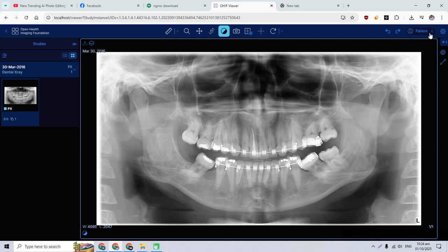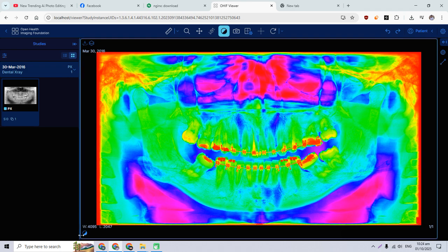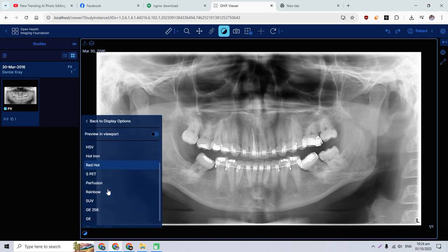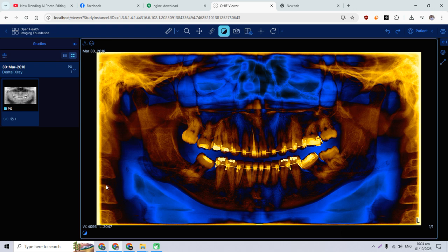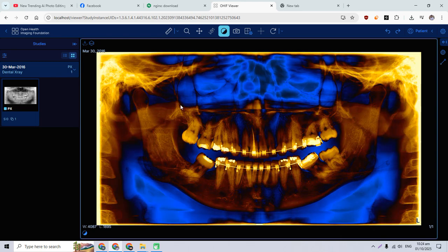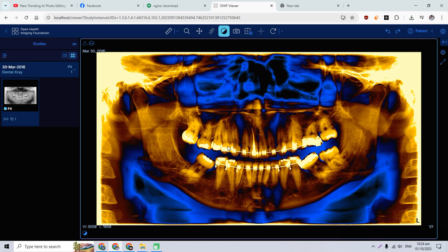You can see how clear it is, so we can apply coloring also, or we can check the grayscale, or the clearest is the perfusion. Yeah, this one. We can unhide, hide, check the visibilities, light up, down, scroll with your mouse cursor. Okay, and we can annotate with multiple tools like these ones. Okay, so we can redo it also through this pattern.